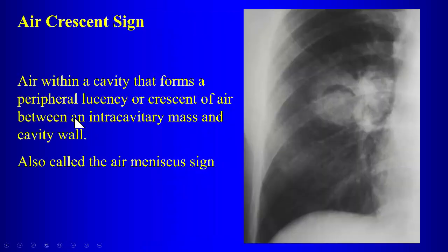Invasive aspergillosis, yeah, although people will use it interchangeably, because the appearance looks so similar. So the air crescent sign is when we get peripheral... Now, this is the technical term. The really technical definition of this is a peripheral region of cavitation within a lesion. So it's peripheral cavitation within a lesion that gives us the air crescent sign.